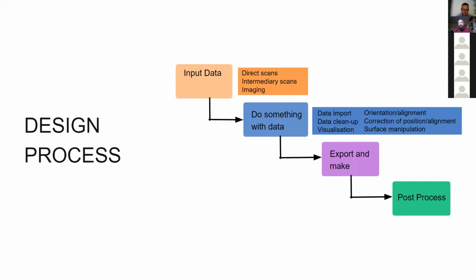This is what basically everybody does in this industry: once you see your patient and you have the information from there, this is your input data. You then do your design, and once you've finished, you move to the manufacturing side, which, even with additive manufacturing, is quite established. There are service providers, and if you have your own machines, you know how to use them. This is, how I would put it, the easy stuff. So anyway, today I want to talk about this blue box, and I'll show you a little bit of what's in there.